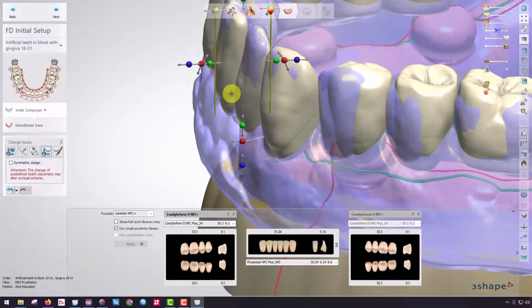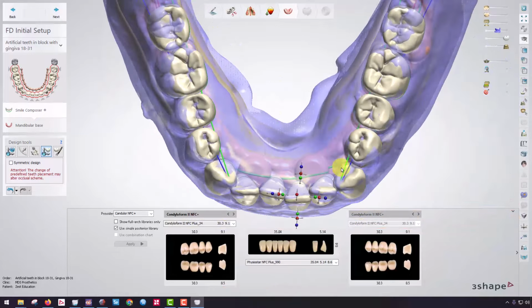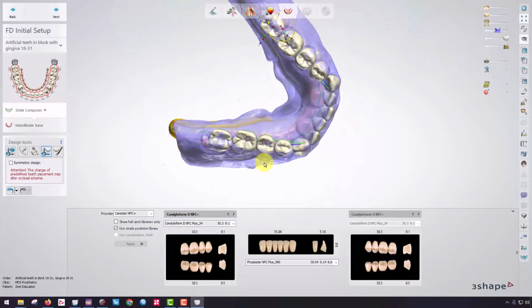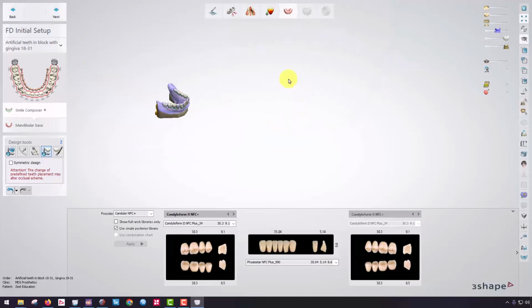Notice here that I've got a little bit of a bigger tooth. Now, if I want to shrink something, I'll explain in just a little bit, but let me go ahead and reline these up because I find it very easy just to move individual teeth, just like so. And then just like so, I'm going to bring them out to where that denture position is, give or take.